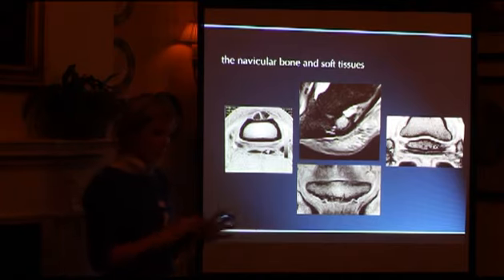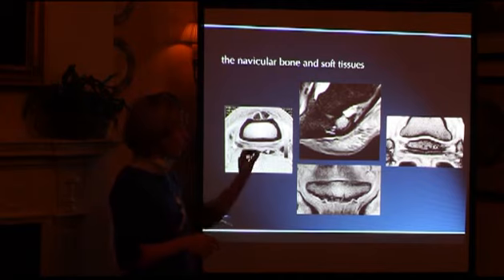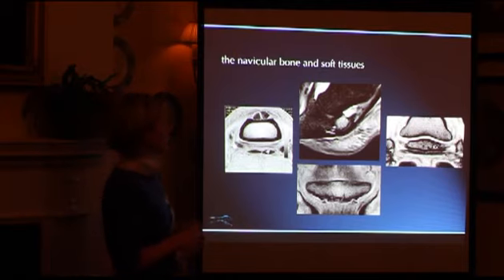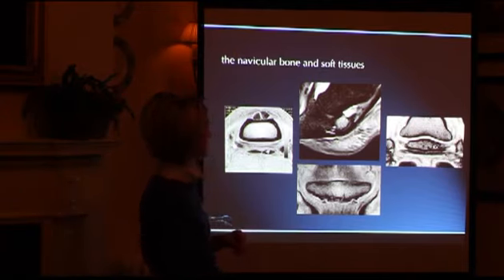Again, there is no way that you're going to detect this on an X-ray at that stage, and it's probably too small a resolution even to be detected on a bone scan, or to be sure that that's present on a bone scan. And these types of detailed images are extremely useful.